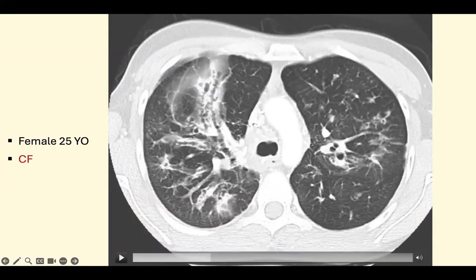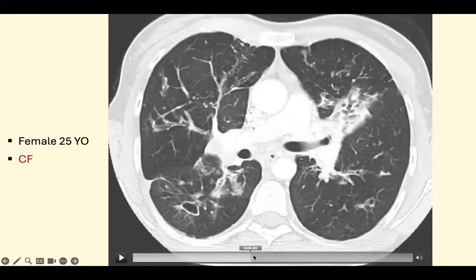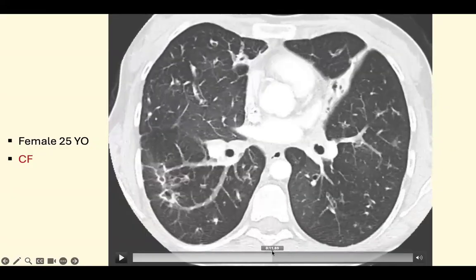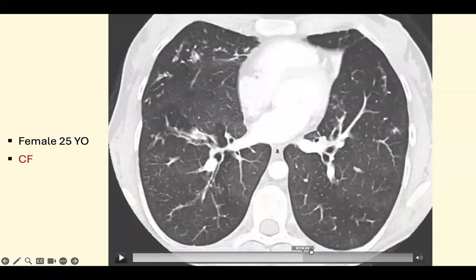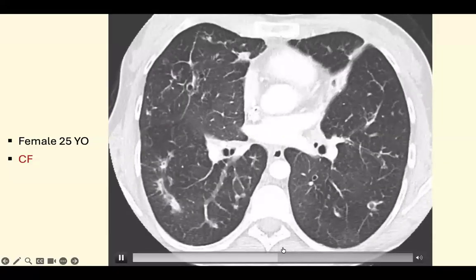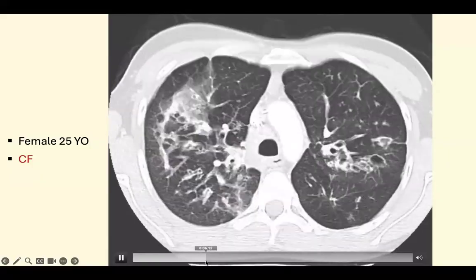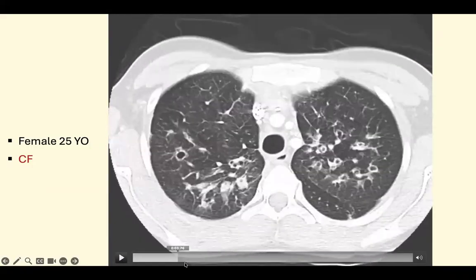But why is it not cicatricial atelectasis? We'll talk about cicatricial atelectasis. It will be associated with loss of volume. Here, there is no loss of volume. And also there is cavitation, another sign. Here we have a cavity. This is another sign of activity of this patient.